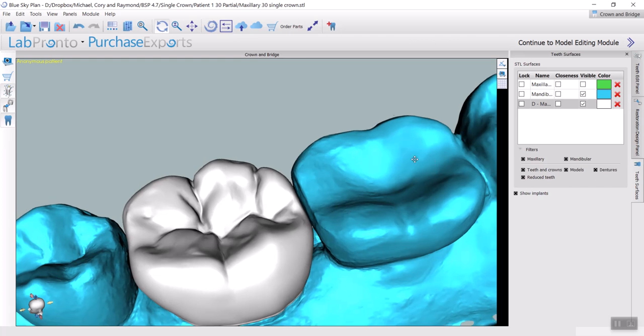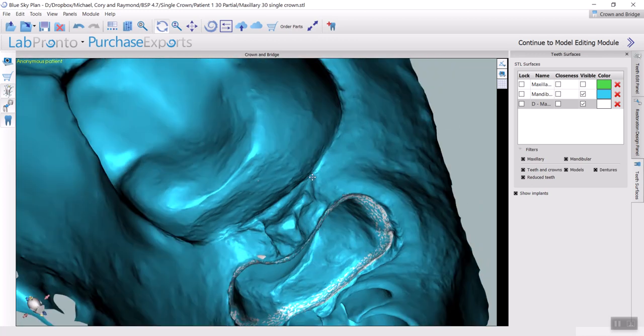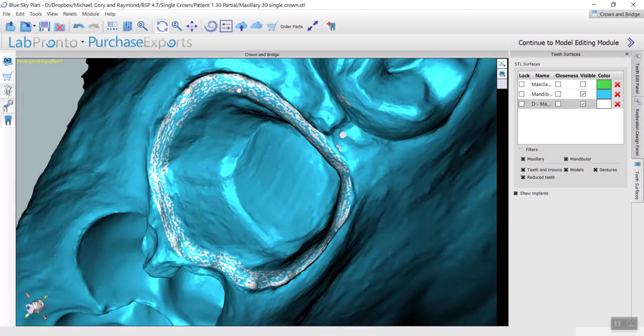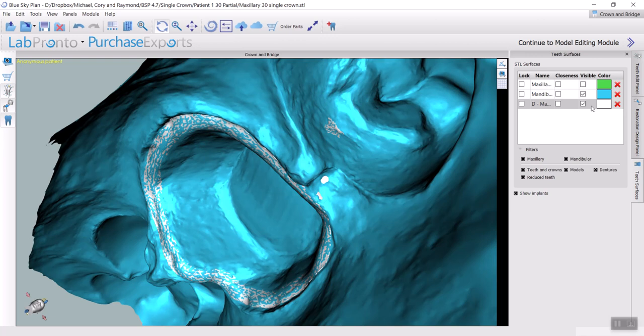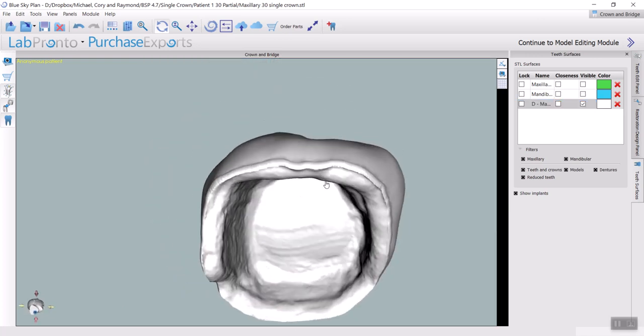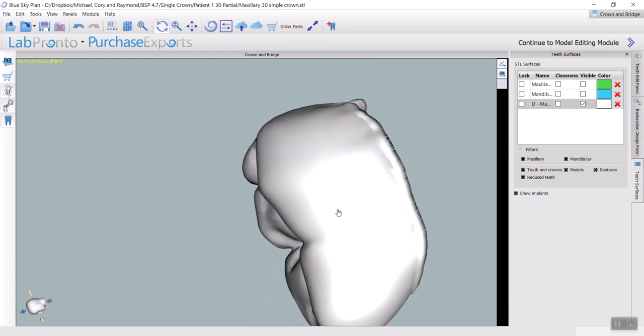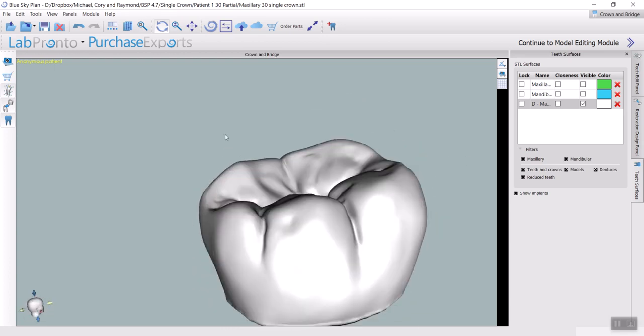I will go and look at the inside of the model, how my crown looks, and everything that we did in the last steps now has a reason. So here's our crown bottom. This is the intersection area, the interface area. This is the anatomy of the crown.